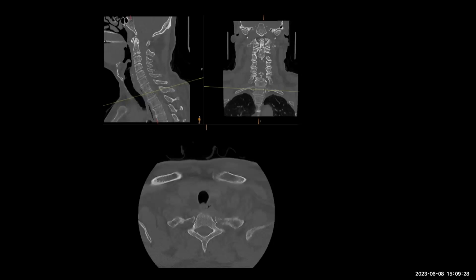Or what you can have is, you might have a CT scan. You can always look at that for the proper numbering. And the other thing that you normally look out for is that the first pair of ribs normally articulate with T1, unless there are cervical ribs. There are telltales to that. They're not very common. But another way to decide these things is to start counting the ribs from T1.